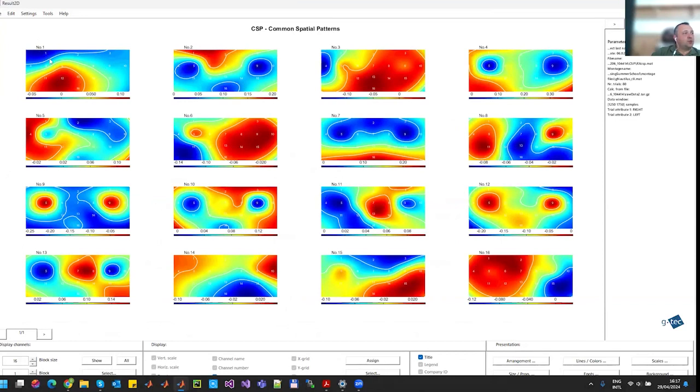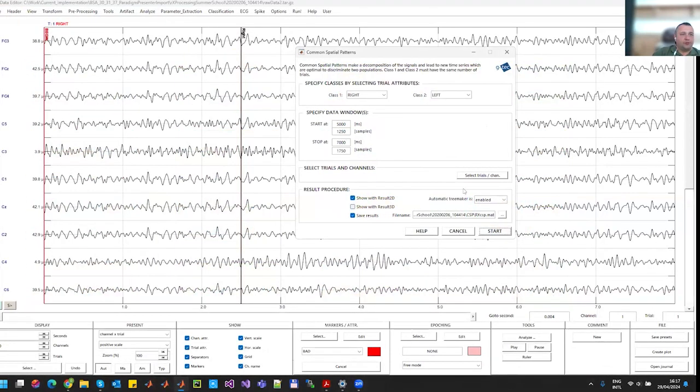With very, very small numbers, we have the electrode disposal on the scalp. And we have these spots in here, right near the C3 electrode, and in here, somewhere about the C4 electrode. Anyways, I will show it to you a bit later in 3D.